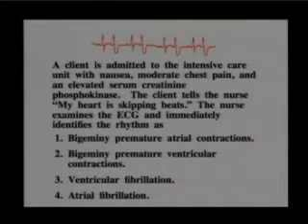Bigeminy premature atrial contractions, 2. Bigeminy premature ventricular contractions, 3. Ventricular fibrillation, or 4. Atrial fibrillation.